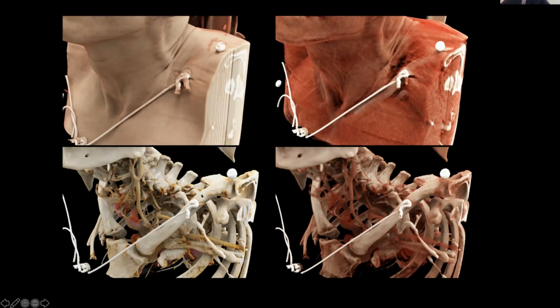Yeah. So on that basis, again, very useful when you want to be aware of, for example, vascular structures. So you can see your common carotid artery, your carotid bifurcation, your internal and external carotid, and the various branches, and you can see the vertebral artery here. And again, there are different ways you could render this. You could render this in a way that shows the bones a lot more clearly, that shows the granularity of the surface more clearly, that shows the vasculature more clearly, or not. So it's important to bear that in mind, but again, that's what it comes back to, your question.